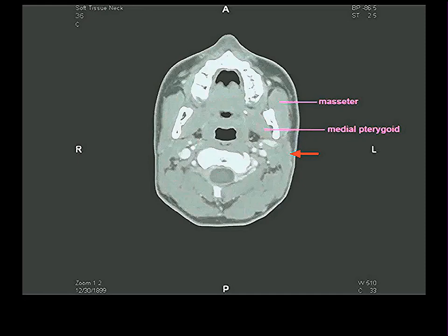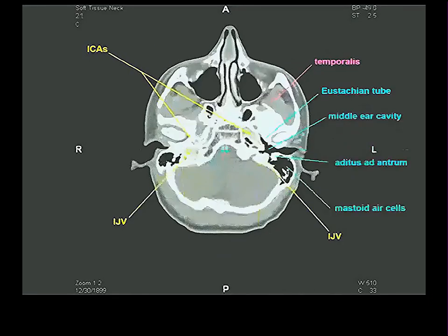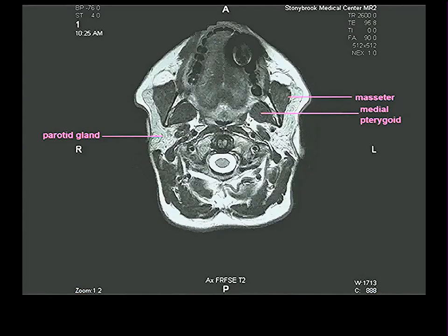That's the parotid gland. We know the parotid gland sits behind the ramus of the mandible and overlaps the back part of the masseter. You cannot distinguish it in a CT because the radiodensities of the two things are identical. If you really want to see a parotid gland, you do an MR. Because now it doesn't even resemble muscle. It's this beautiful, white, floccular sort of thing.